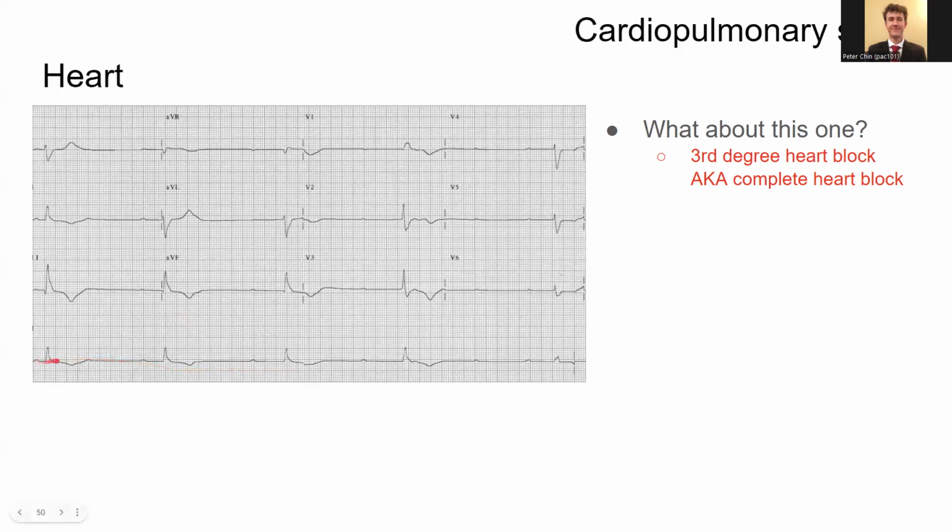And you might be tempted to look at this EKG and think, oh, this could be a Mobitz 1, because this QRS complex has a short-ish PR interval, and then this one has a longer one. And then this next one has a longer PR interval, and then it looks like this one's even longer, and then this one doesn't conduct to anything.